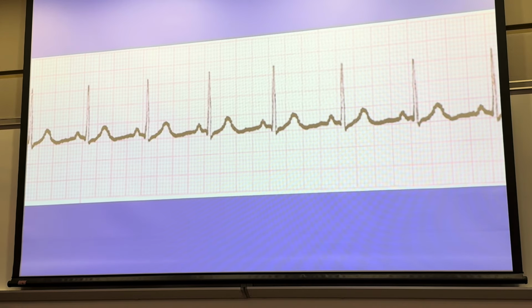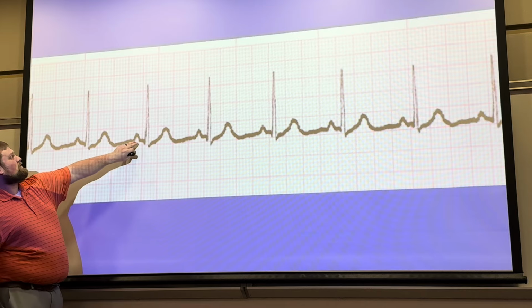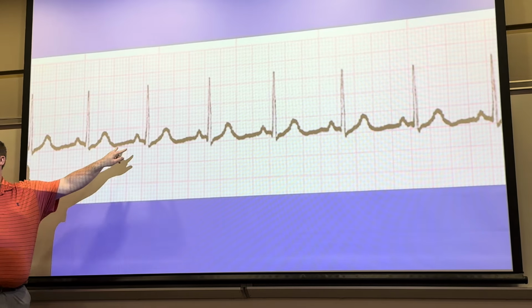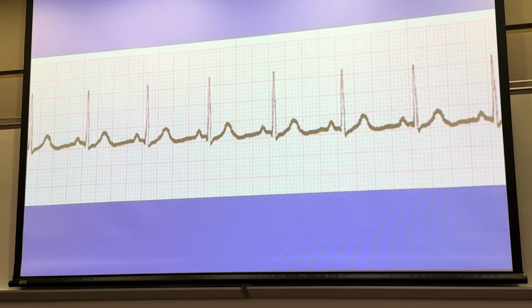All right, Jess, what's this one? Is that normal? Homosinus. Everybody agree? Yep. So depending on how many QRS complexes we count, we can get between 70 and 80 heartbeats. Do I have all my parts and pieces? Yes, I do. Got my P wave, my QRS, my T wave. Is my PR interval short? It's in normal range like it should. So just normal sinus rhythm. Pretty straightforward on that one.